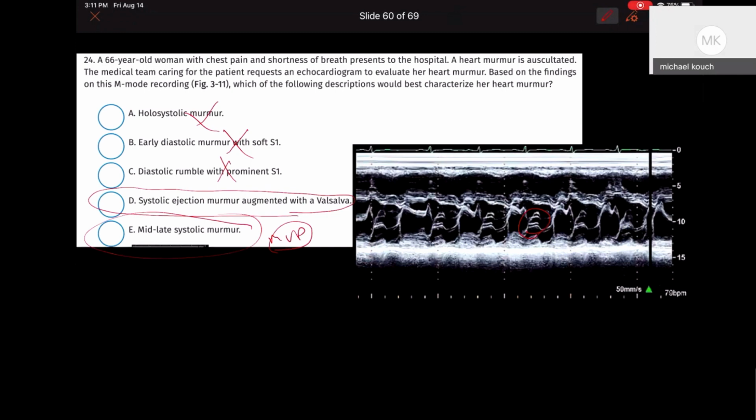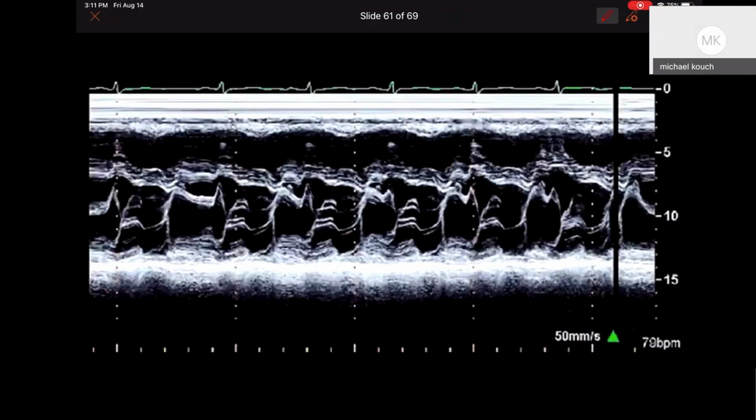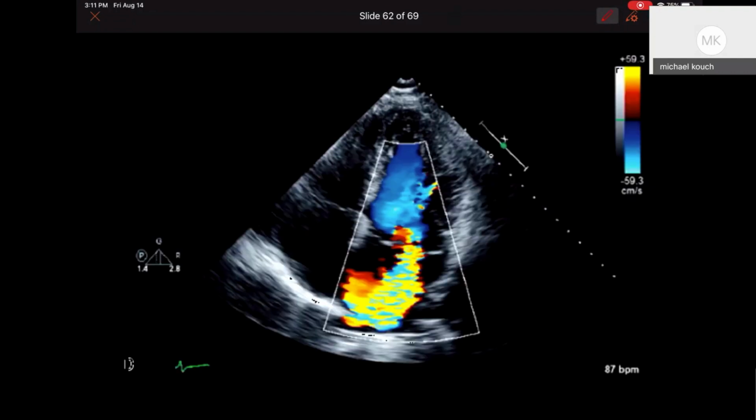All right. I'll email Dr. Asher. So this is our mitral valve prolapse, right? When they're supposed to have coaptation, we start to see this leaflet and this leaflet separate. Good. And this is an example of why you're going to have that murmur. It's because it's going to be secondary to regurgitation.